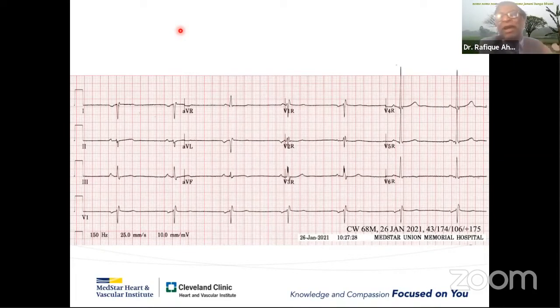So you're right. The question would be, shall we? If you want to be idealist, of course you will have to swap the leads. In that patient, if you want to represent a normal ECG, then you will have to swap the right arm and left arm, and left leg and right leg. Yes, absolutely right. And that will make it a perfectly normal ECG. And you will completely confuse the people.